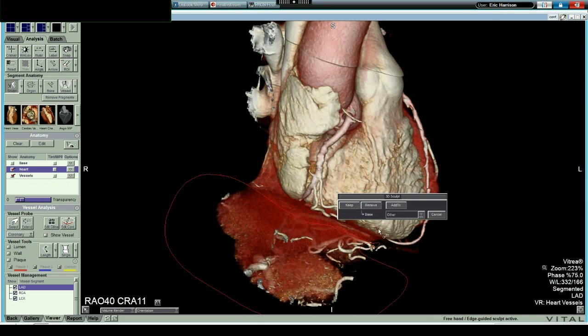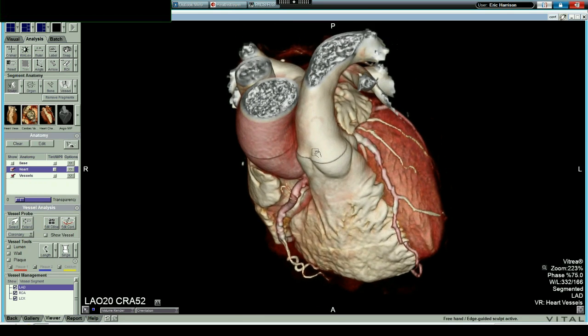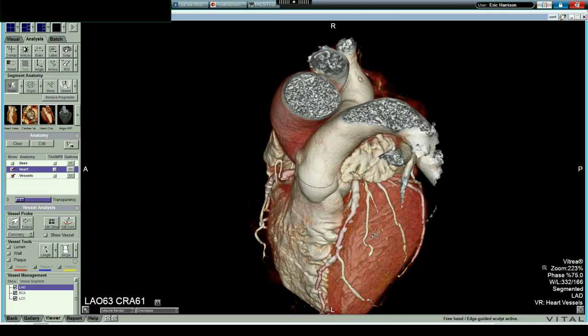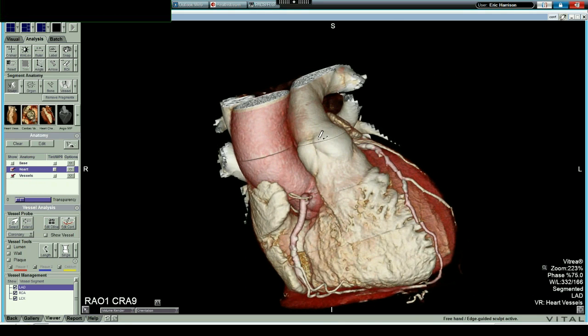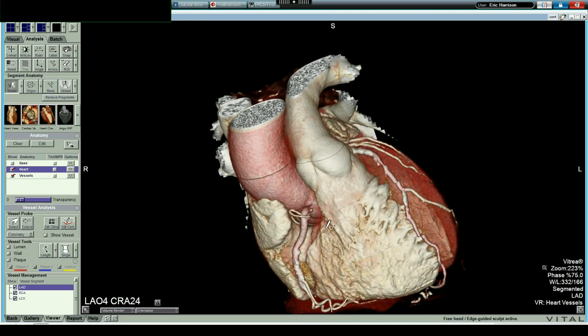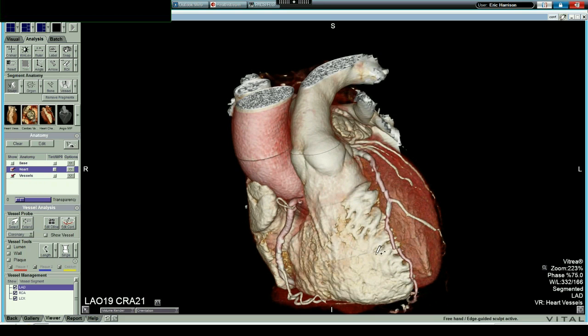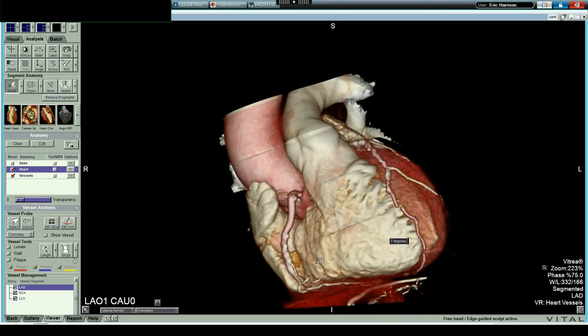The Jack Saunders model is just like this, and so the similarity is striking. Frank Netter used to do drawings that were similar to this, and so we're struck as we look through this by two things. One, sometimes the coronary arteries don't line up, and that's where these slices, 1, 2, 3, 4, usually 4 or 5 slices with the 64 slice CT, where the slices actually are put back together again in the heart to create an amalgam, and sometimes they don't quite line up, so that creates these artifacts that are readily recognizable along the fault line.